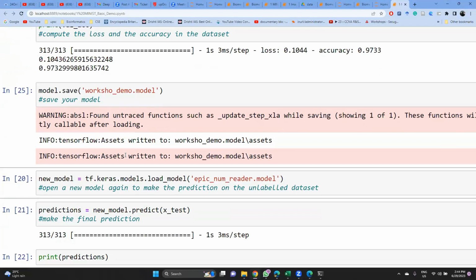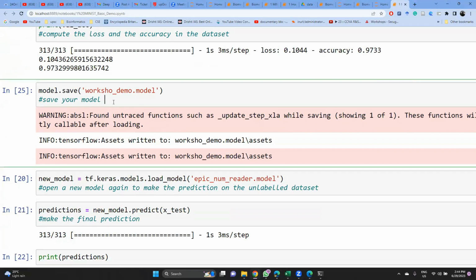If you are running this code on Google Colab, it is saved over there also. But for heavy extensive work, if we have to build good models, then we have to do our work on standalone systems. Google Colab is helpful for tasks which require less time, because I think it gets reset after 24 hours, so all the values get depleted.